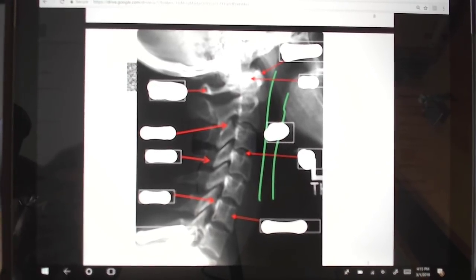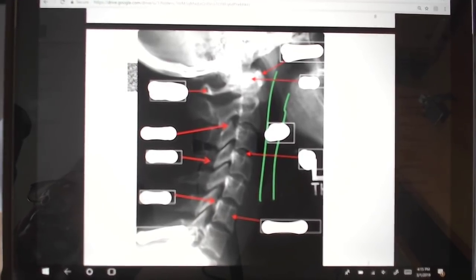All right, so we're gonna do just a quick little video on how to read these CT scans and X-rays. Sorry, the video is a little blurry and it's wobbling around. But honestly, they're not gonna teach you this in class, so this is probably better than nothing.